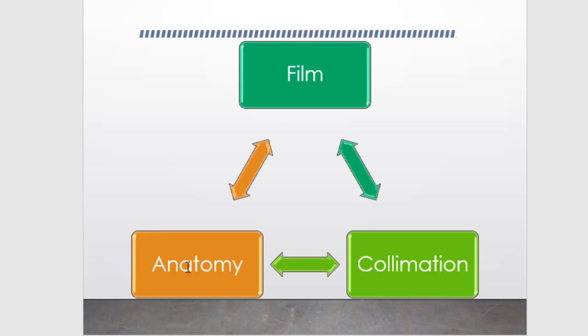Okay. Next is about the alignment. We already covered P, A, C, E, and M. Now we go for A, alignment. In the part of alignment, we need to check alignment for three things. First, alignment between the film border and the collimation border; alignment between the collimation border and the anatomy border, or center of the anatomy; then center of the anatomy to the film border. From there we know whether the alignment of the image produced is good or not.